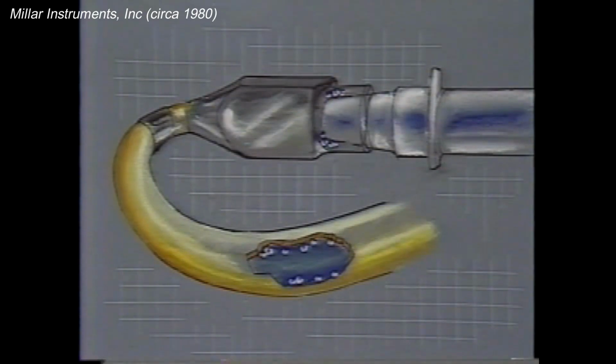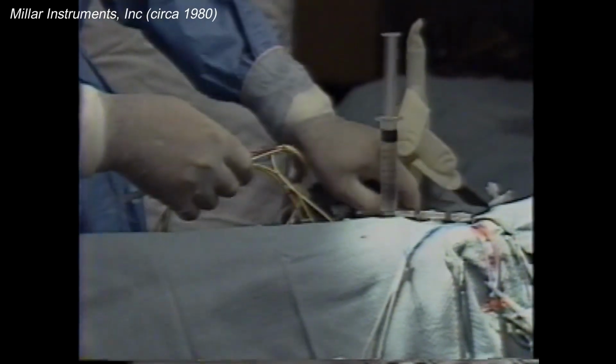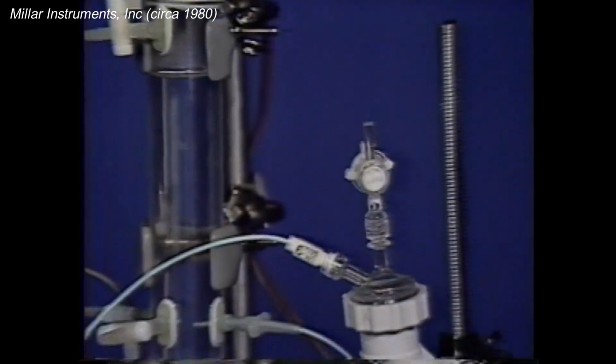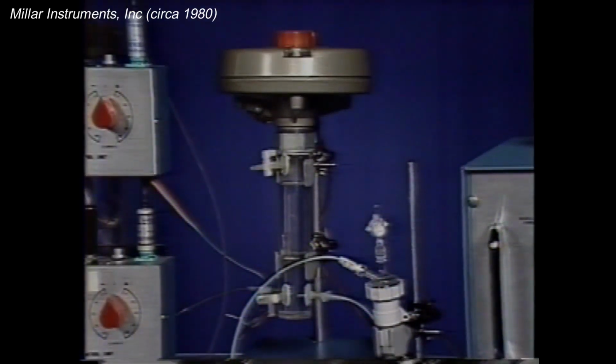One of the common problems in using a fluid-filled system for monitoring blood pressure is that of air bubbles in the line. Normally, there are one or more stopcocks or manifolds in place where hidden air bubbles can remain trapped. Here we have the ideal situation: a fluid-filled catheter coming out to a transducer and no complex manifold involved.